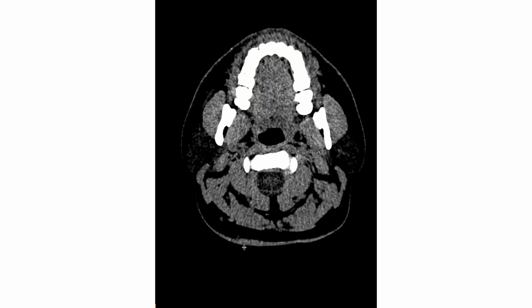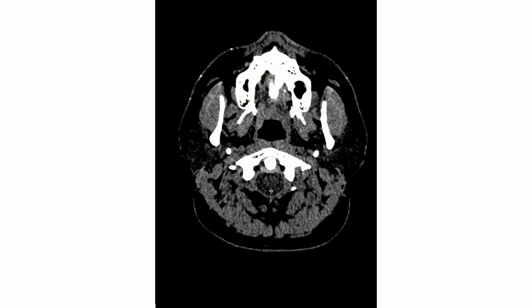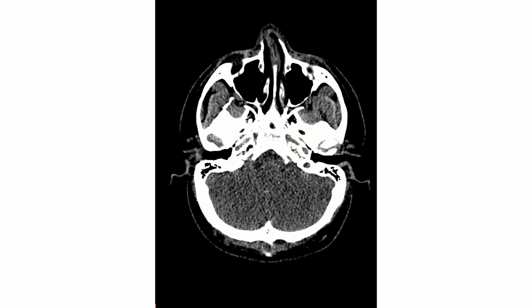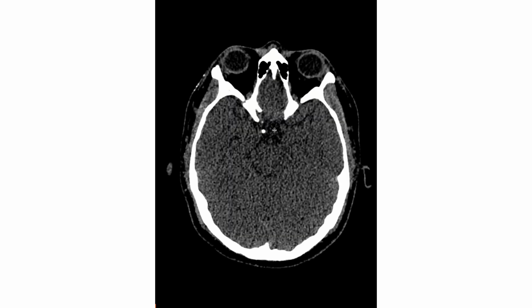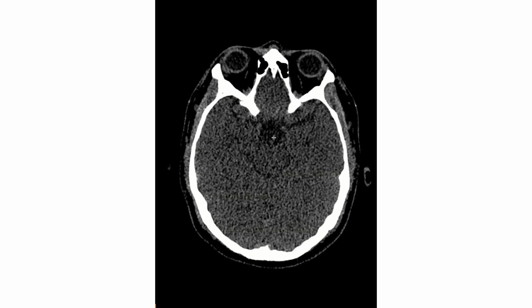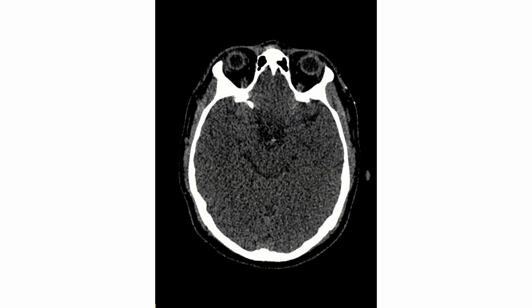Now, what I do usually, I just go to the foramen magnum. So this structure is the foramen magnum, upper cervical spine area, and I just try to look for any subarachnoid hemorrhage here. Sometimes that's the only way that you can find them, otherwise it's going to get missed. And then I look at my fourth ventricle, specifically here, right there. You're just going to have your fourth ventricle. I go up, I look at my basal cistern. You see how this structure, with CSF density here, is very well patent.